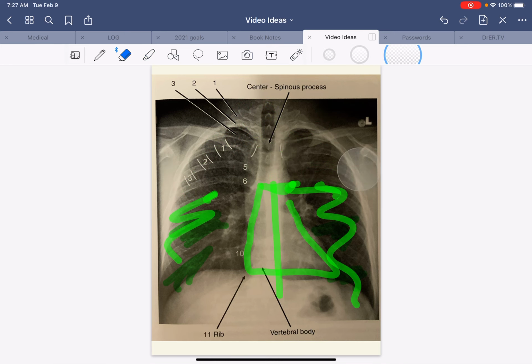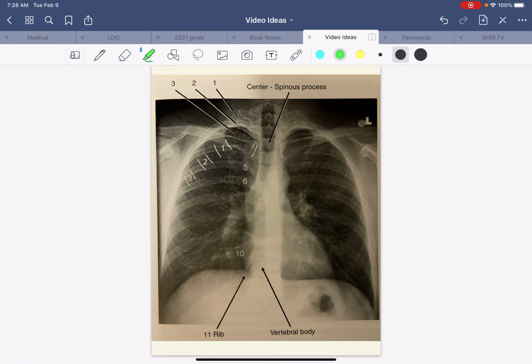So we talked about the initial overall review of the x-ray. Then we talked about how adequate the x-ray is. And then we do a targeted approach. So pattern recognition. So again, does this patient have pneumonia? Does this patient have heart failure? Does it look hazy? Does it have peribronchial cuffing? And these are patterns you will learn over time. So don't expect to know them right away. And this is something we will discuss in future videos of how to interpret radiographs.